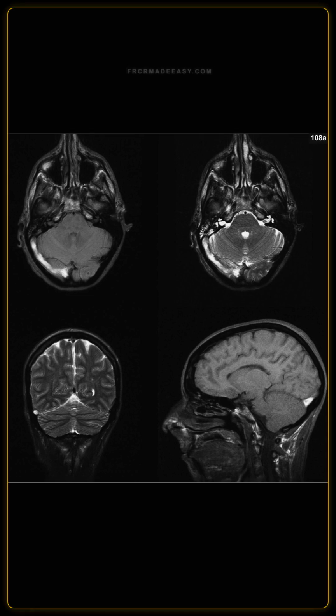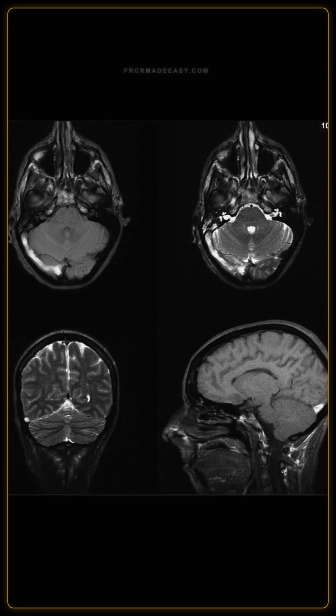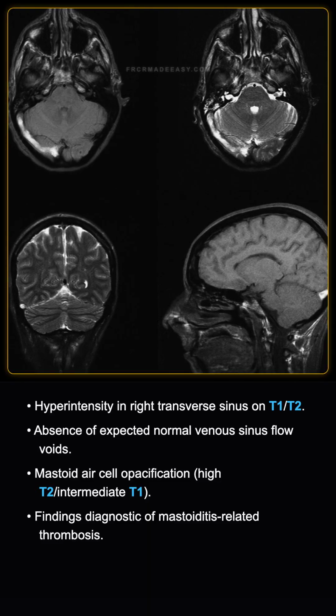A 35-year-old male patient presented with headache. I'm showing you multiple brain MRI slices. Describe the findings. All right, let's take a look.